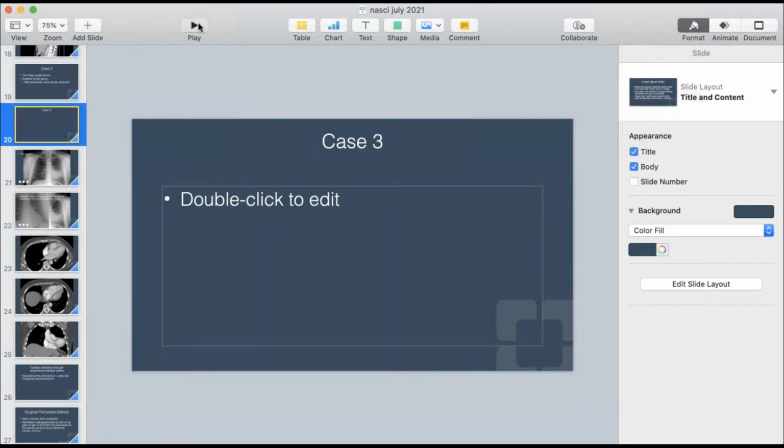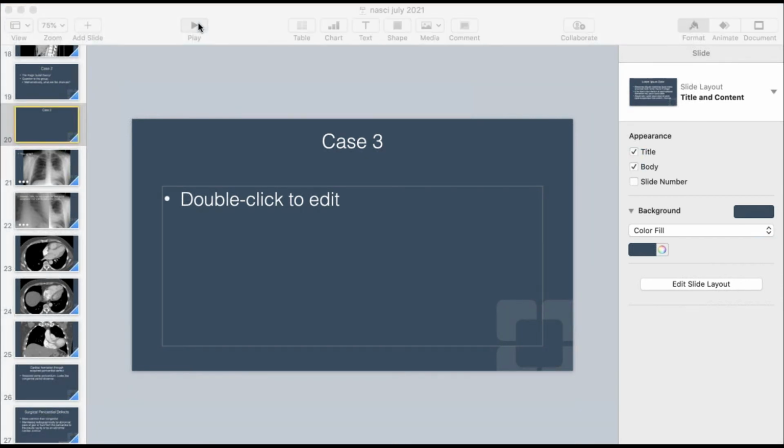Very good. So infectious endocarditis with probable embolic event to the distal LAD, and late iodine enhancement on the CT and aneurysm on the functional movie. So CT can do it all sometimes.